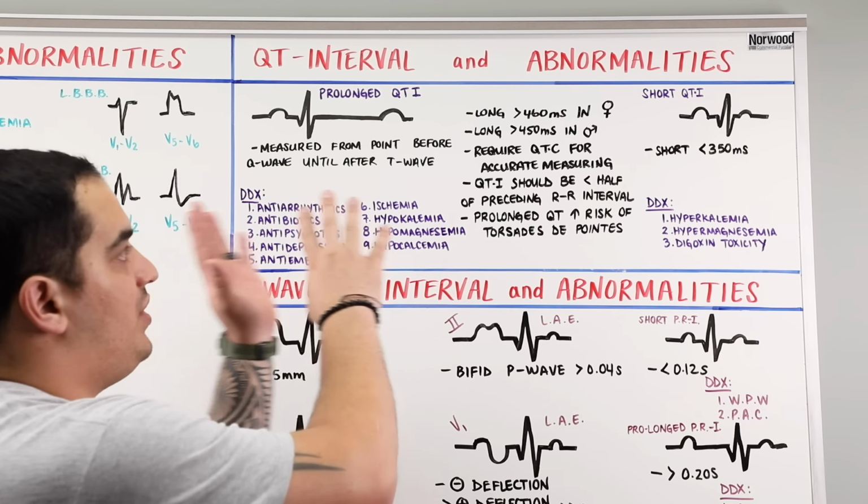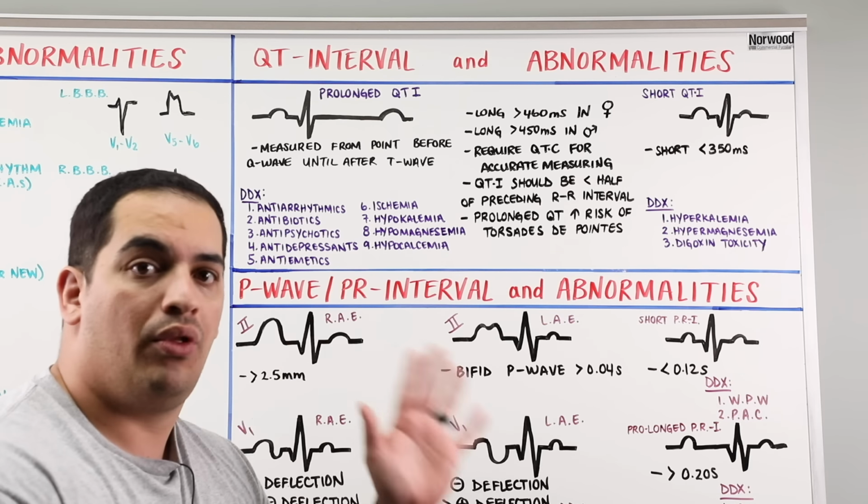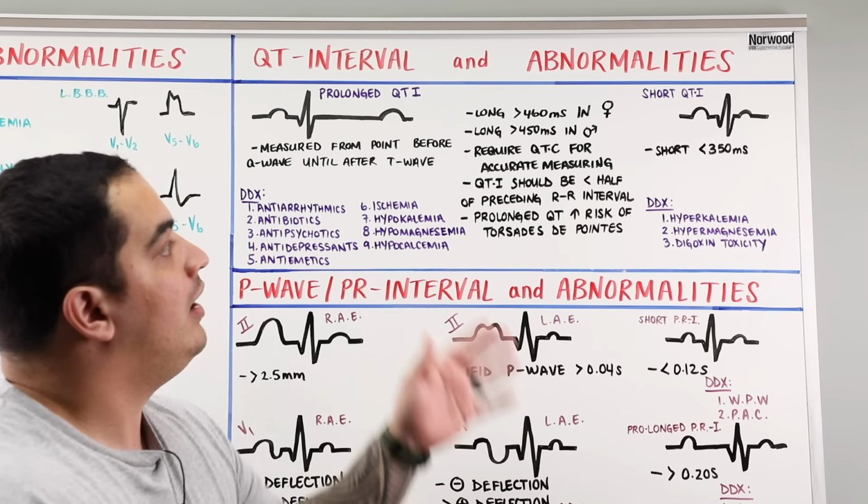So once you see a prolonged QT, think about your differentials. If you don't think about it, you could miss it. Rule those things out and treat accordingly.